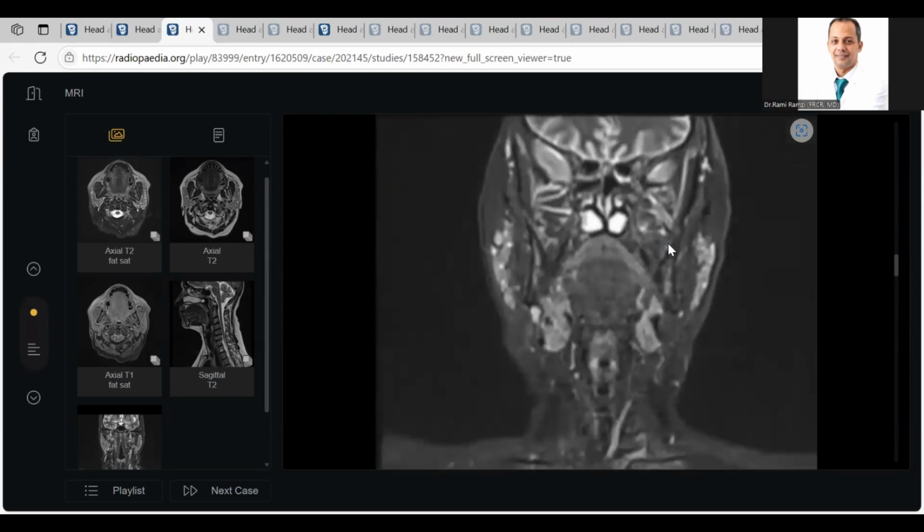Before commenting on this, I wanted to correct something wrong. Fibrous dysplasia is ground glass in appearance because it has a fibrous matrix. A bony matrix, like in osteosarcoma, gives clouds of calcification. But in a fibrous tumor or fibrous abnormality, the fibrous matrix gives the appearance of ground glass. Sorry, but a correction is a must.